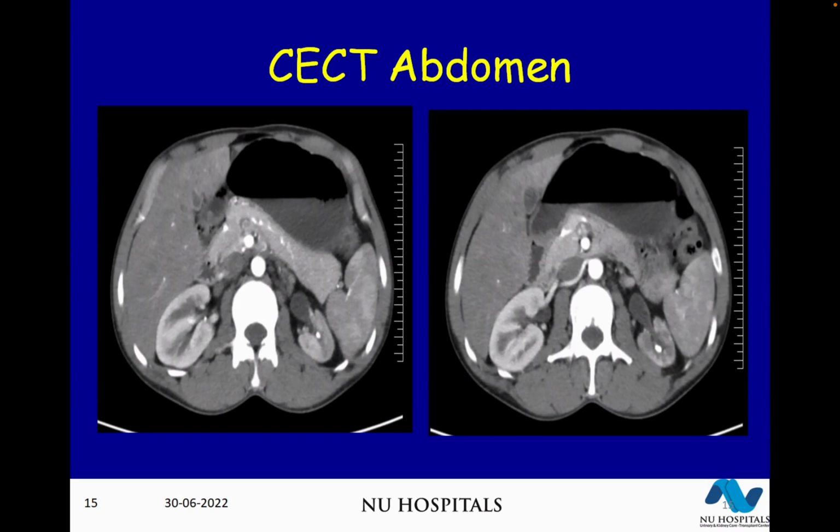It looks as though somebody may have given ESWL and fragmented. Even then, it's not very bizarre. So whenever there's bizarre calcification, you think of pathology. You think of dystrophic calcification and not standard metabolic calcification. All right? And that is what is worrying him.